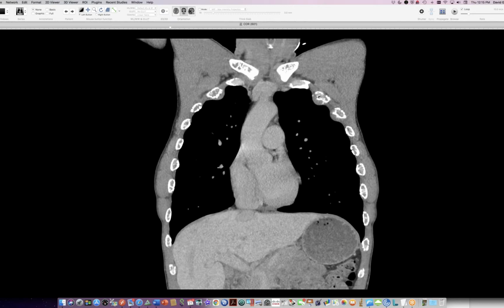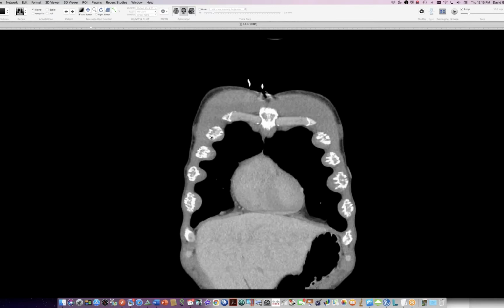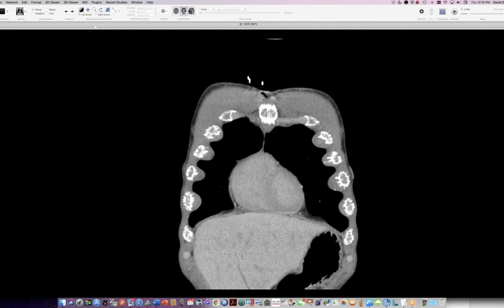And you can see that all these soft tissue masses are really pretty much adherent to bone, and you could easily hypothesize that it's the cortical defects that allow the marrow to leak out and set up housekeeping outside the bone, because extramedullary hematopoiesis tends to be osteotropic. Okay, so that was abnormal, and a satisfying diagnosis. When you recognize extramedullary hematopoiesis, it just leaps out at you. No hesitation with that look. It was thought by the overnight resident to be lymphoma or metastatic cancer. Any comments?